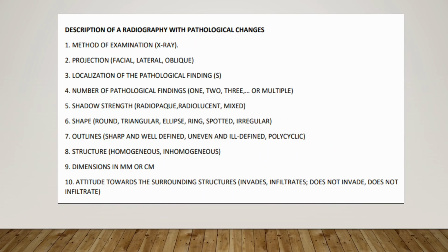Finally, this is the description which you need to familiarize yourself with when trying to answer a radiographic question. So let's just quickly go through. Method of examination, you'll just say it's a radiographic examination, radiographic or X-ray. Then you say what projection it is. Usually it'll just be frontal.